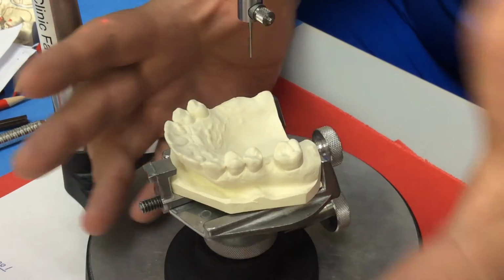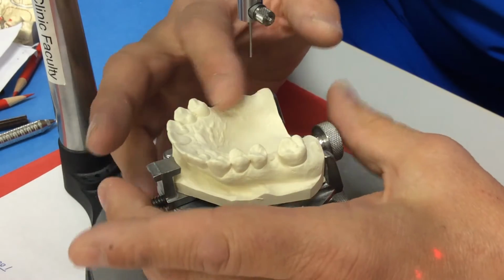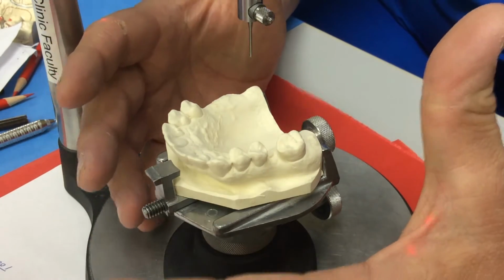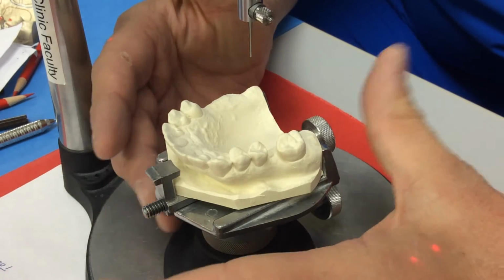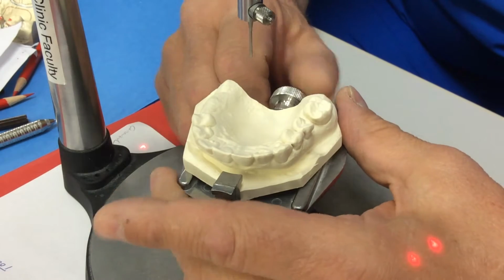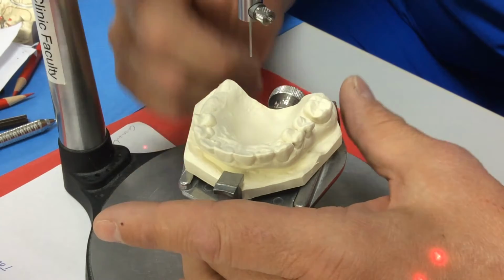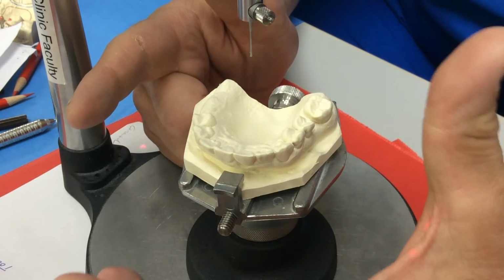I've had a lot of questions about whether an I-bar can be used in other situations. When you're on the distal extension side, we call it an RPI. That means mesial rest, distal guide plane, and an I-bar. An RPA means a mesial rest, a distal guide plane, and an Akers clasp. That doesn't mean that we're not going to use an Akers clasp or an I-bar in other situations. We will. We just don't call it RPI, and we don't call it RPA. We call it an I-bar, or we call it an Akers clasp.